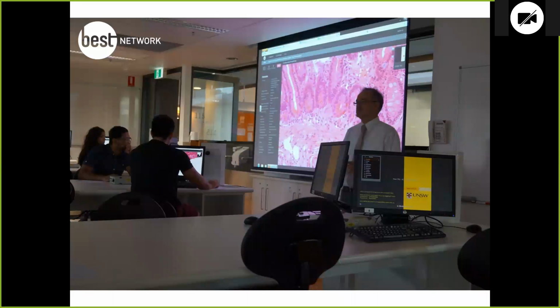When the Slice annotation tool was first developed, it was envisaged that academics and students would use the annotation tool to make personal notes on images, and classes would run where students annotated while their teacher guided them through the features of the images. Here we have Professor Nick Hawkins teaching a histopathology class at UNSW, focusing on the microscopic features of the colon.